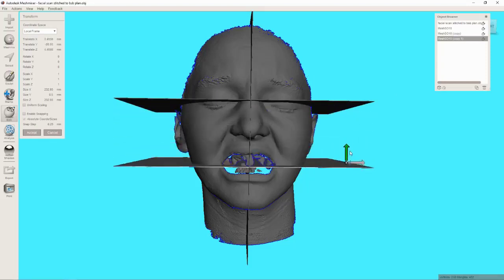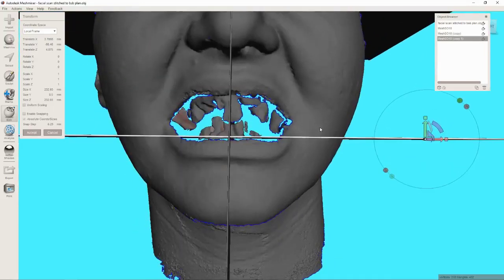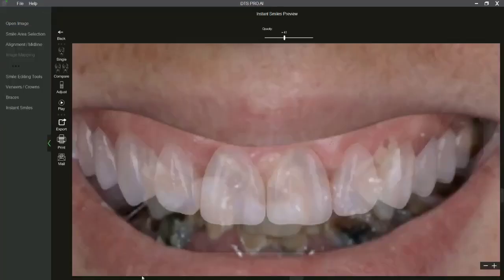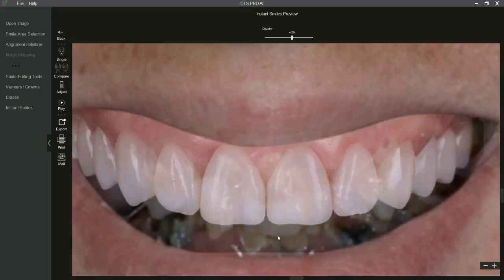This one, now, you could just pull one down in this neighborhood just as a reference, but what I like to do is, if I've got any references of maybe where teeth currently are, basically put this right where I would set the incisal edge of the new teeth. So think back to our simulation, right? We said here is her existing incisal edge, and if we wanted to achieve that simulation, then we would need to take that edge from right here to right there. So let's just do that.